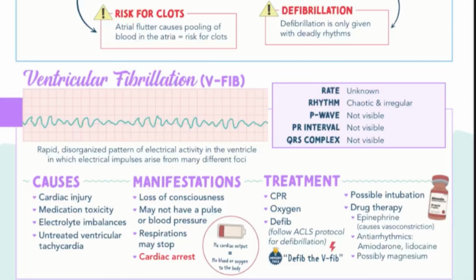So there is no SA node, and the AV node is present, but many different foci are also present and generating impulses. So it is a life-threatening emergency. The treatment is to start CPR, followed by defibrillation.